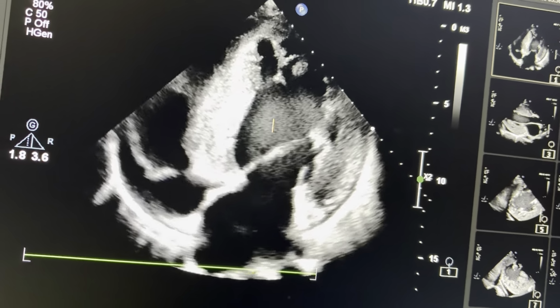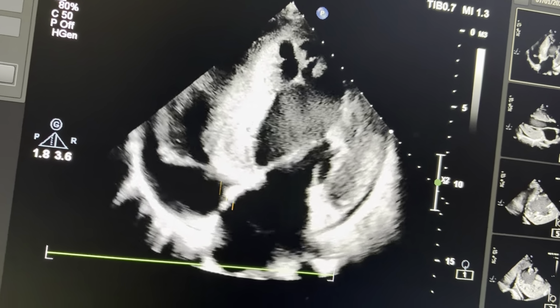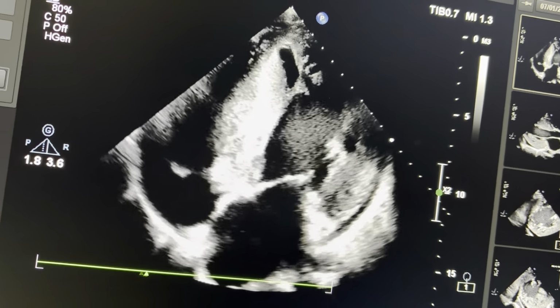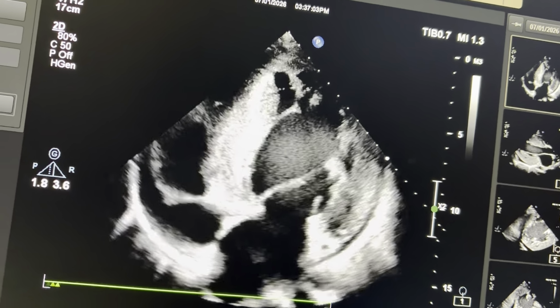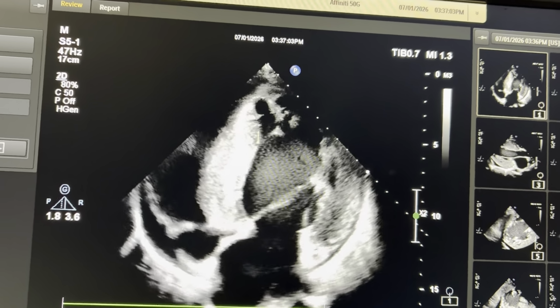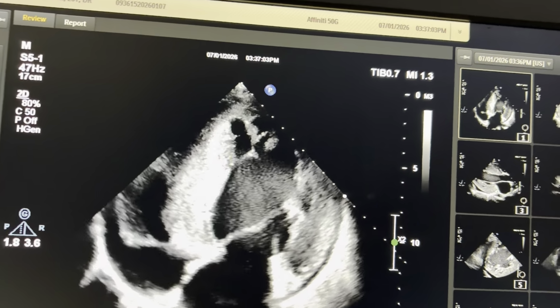So obviously, a structure: this is left ventricle, this is right ventricle, this is left atrium, this is right atrium. What you see is the interventricular septum. This interventricular septum is having some sort of breakage in the continuity. That made me analyze the other parts, so that I can find out what is the real pathology behind this image.